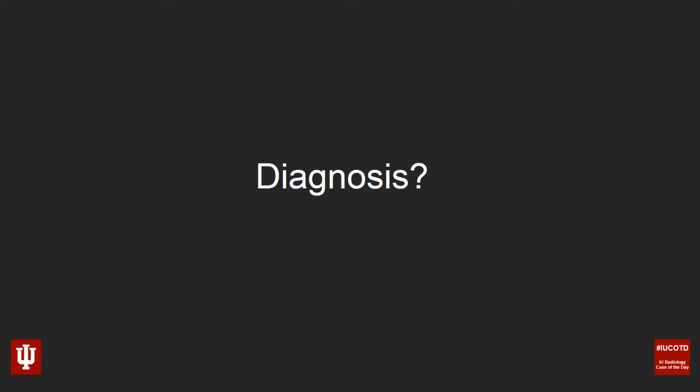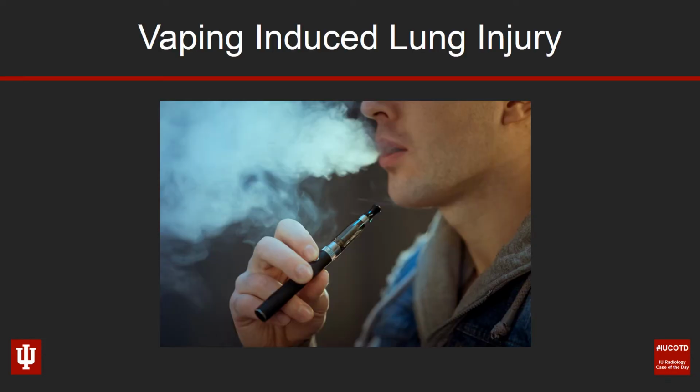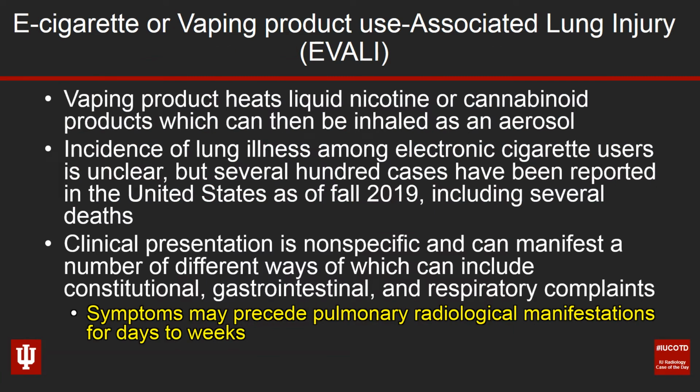So kind of taking in all that information, both clinically and imaging wise, I'll give you a couple of seconds to gather your thoughts and come up with a diagnosis. Okay, so this was a vaping-induced lung injury. So now I will hand this over to Dr. Sarah Lay, where she's going to talk about her own experience with diagnosing this condition.